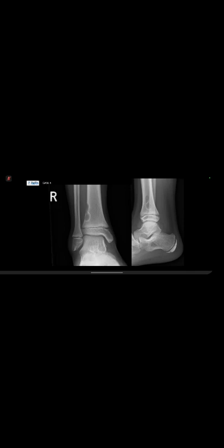When you follow these up, or when you incidentally follow these up, they tend to become a little bit more sclerotic until they completely remodel to normal bone. They are also known as fibroxanthoma, fibrous cortical defects. They're all on a spectrum of the same process. They're benign fibrous lesions.